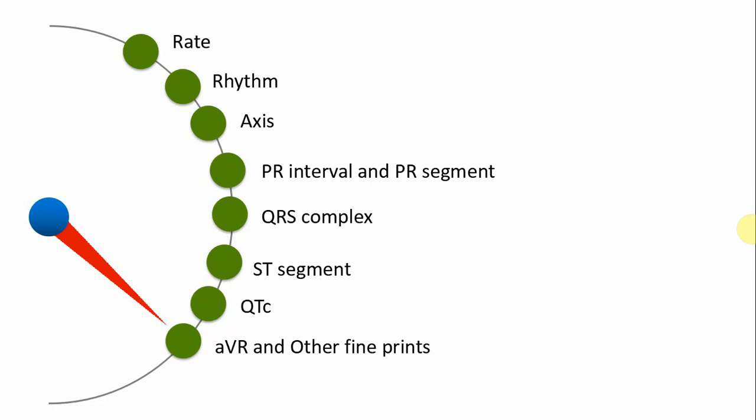So usually when you read the ECG, we look at these steps. There are 1, 2, 3, 4, 5, 6, 7, 8 steps, and these are the 8 steps which will give us some rough idea. But the machine can actually get most of this information. What is important, and why a doctor is required, is the last bit, which is the synthesis.